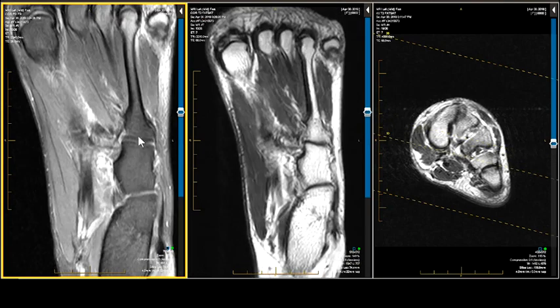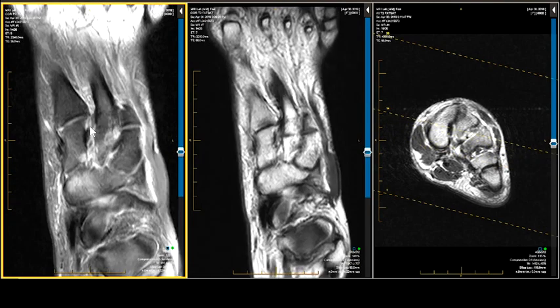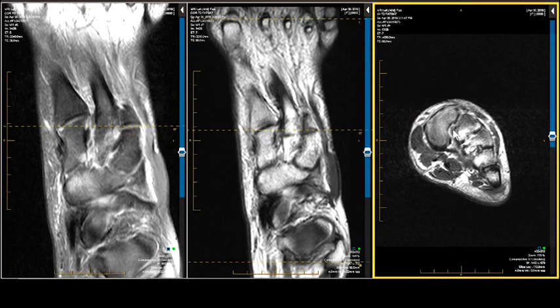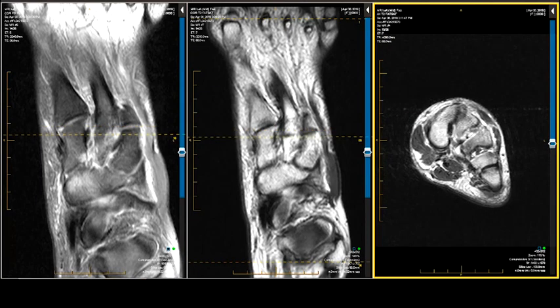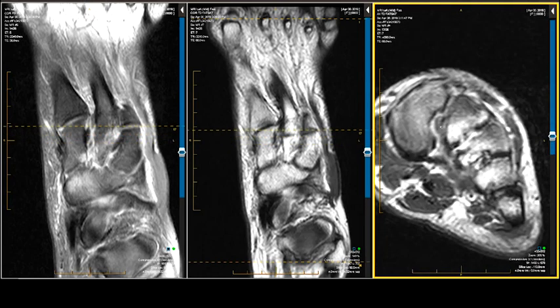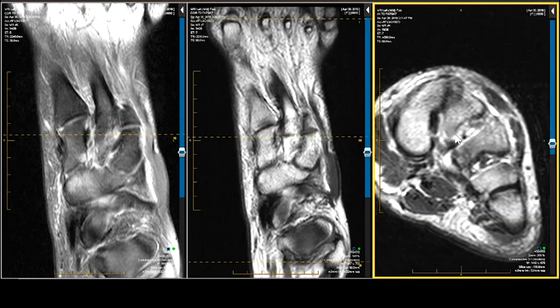So let's go to the Lisfranc ligament. There's the tear. You can actually see it right there. It's gray and it's black. But it's not easy to make the diagnosis of a tear in the short axis. You know, it looks contiguous, and a lot of people will underread it for that very reason. Because you're looking for this tiny little slit, and you just can't resolve it or pick it up in the short axis view.